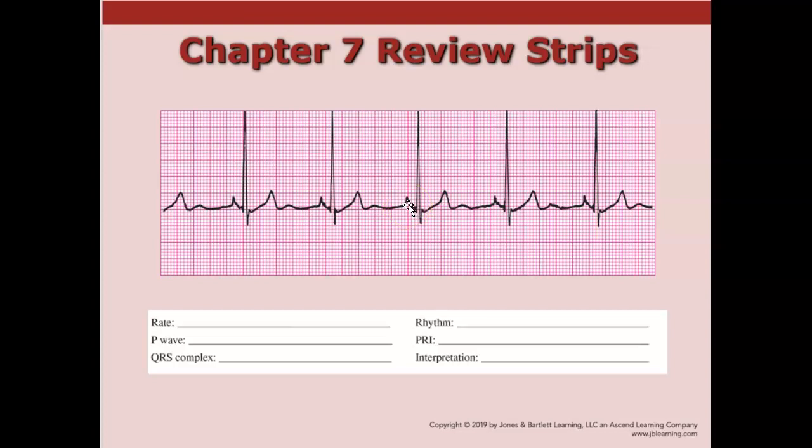Now, when you start doing these, I want to make sure I explain this. When you have the assignment on the computer, I need you to put in your measurements, not "within normal limits." What I need you to do is put in the 0.16. Now, if I measure it at 0.12 or Josh does, typically he and I do this together, if one of us measures it a little bit off than you, that's not wrong. It can be everything from our perspective, the angle and sight and all that. But if you put something really weird, like if you put in a number of say 0.12, but it was 0.24, that's going to be wrong. But don't worry about just those little insignificant differences.